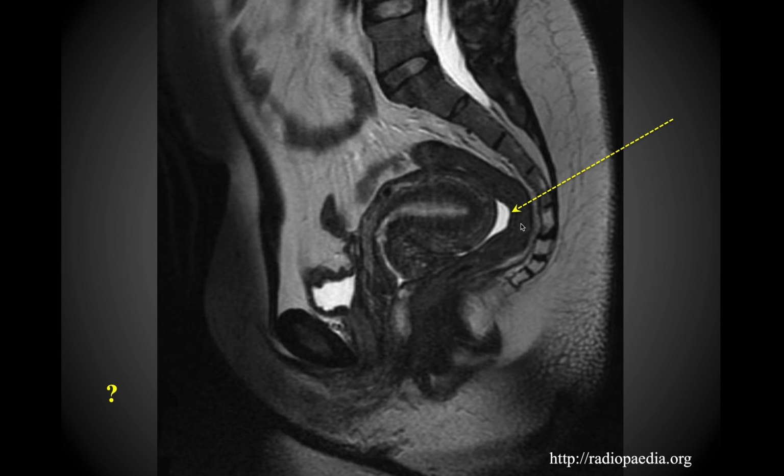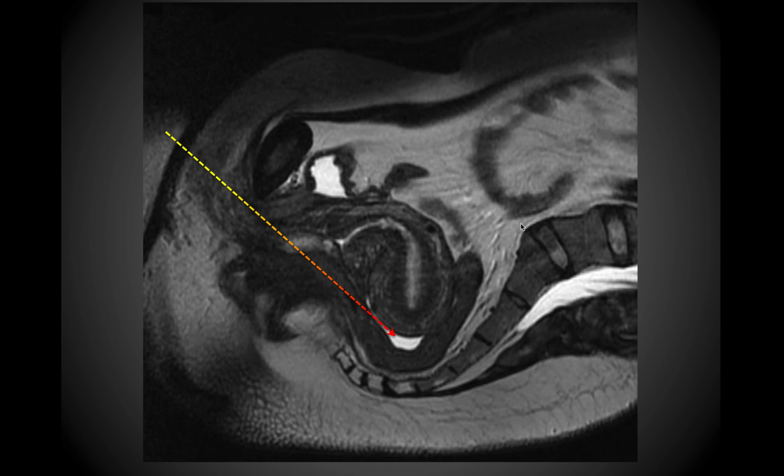And then I mentioned before that there's this fluid here, so I want you to think for a moment about where that fluid would be located in the female abdominal pelvic cavity. Here we have the same image just turned on its side. So this is going to be the fluid that's accumulating in the retrovesical or rectovesical pouch. Sorry, rectouterine pouch, excuse me.